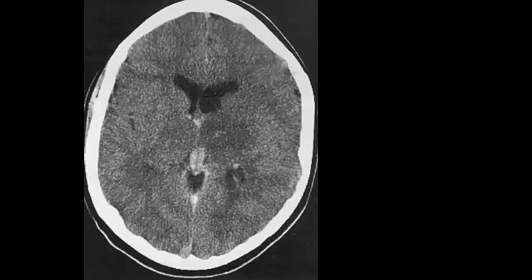There is edema in the left side, okay, here, which is a hypodense area. So hypodense density along the thalamus and the basal ganglia. Okay, I agree with you. So what else? So left thalamic edema. Thank you, Dr.